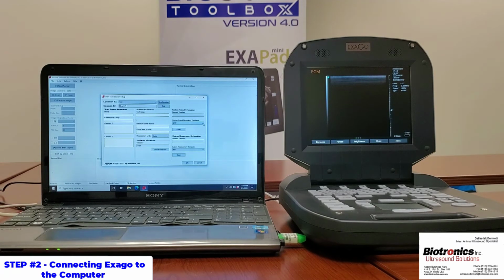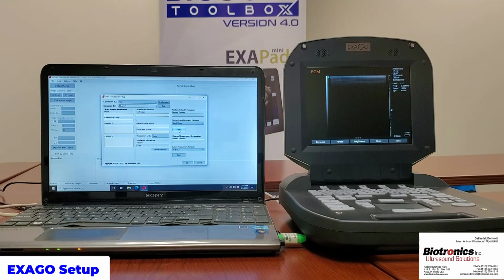Also, if you want to have your templates, we have another video that explains all of that, or the user's manual will explain it also. We can open those templates and do whatever you would like with that. You push OK.